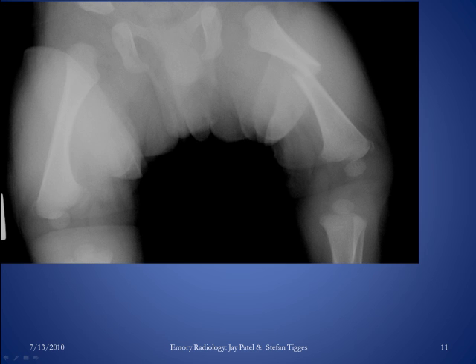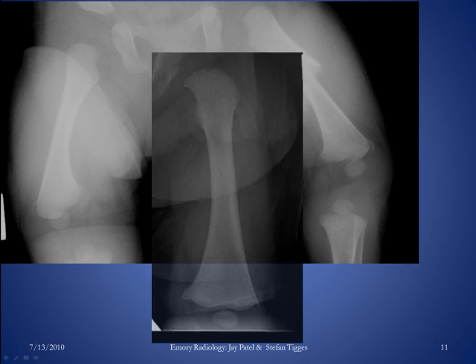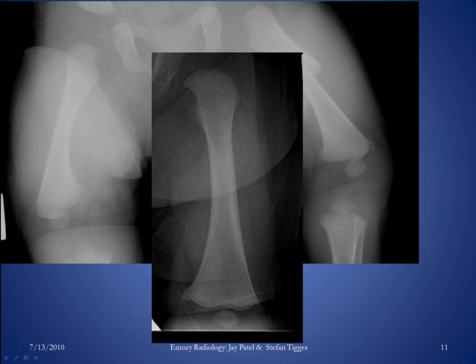Here is another radiograph demonstrating a fracture of the left femur. It's a through and through fracture, relatively acute, very lucent, and there's no other real bone formation around that fracture site. On the right femur distally, you're seeing some slivers of bone that are classic for classic metaphyseal lesions, and you are also seeing that in the distal left femur. On this frontal radiograph, you are seeing 2 slivers of bone. It's harder to see on the right side, but here we're seeing basically a corner or bucket handle type fracture in the distal left femur.